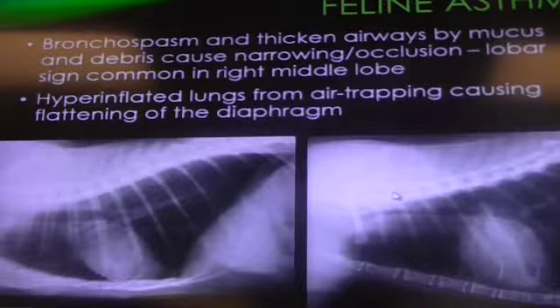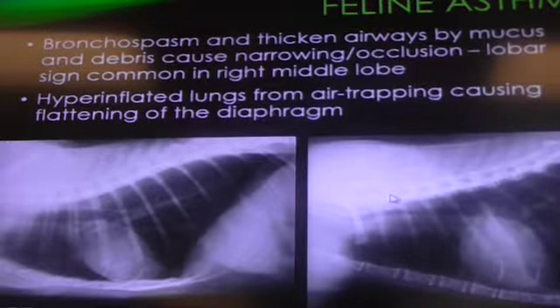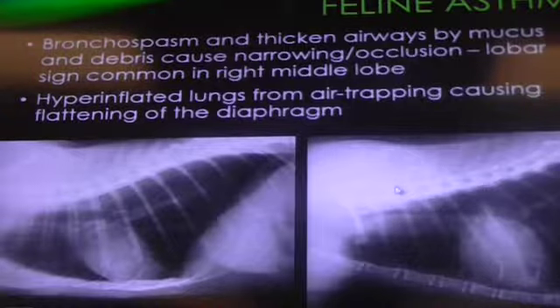It's compressed. So it's completely compressed and all you are seeing is left lateral? No. Yeah, so the correct answer is, they are superimposed on each other. Okay? So what you are seeing here is both right and left cranial lung lobes. Okay? So right cranial and left cranial, they are superimposed. All of this is superimposed right and left.